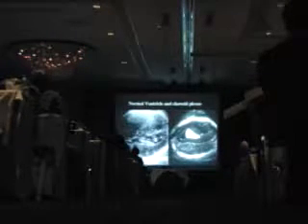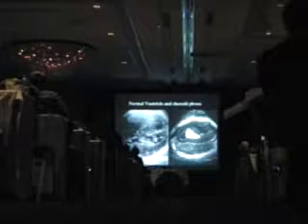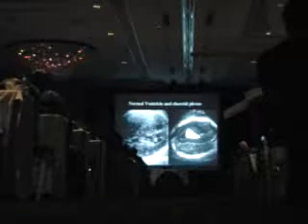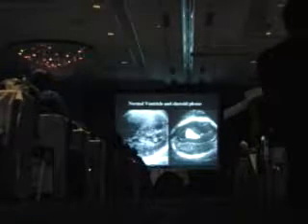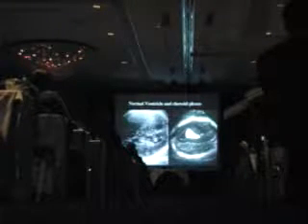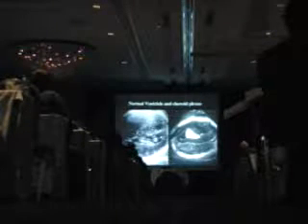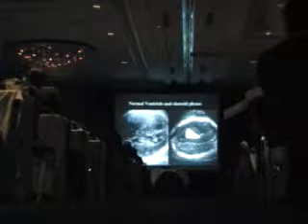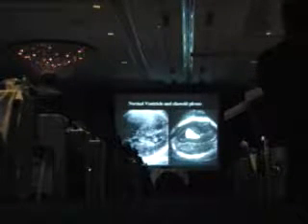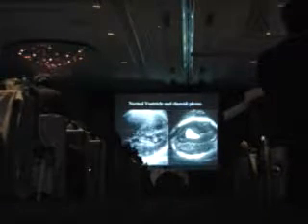And what's nice about this measurement is that it is one of the few measurements, in fact, it may even be the only measurement that is constant throughout the second and third trimester. There is hardly any other measurement in the fetus that is the same throughout gestation in the second and third trimester. So you can measure it. It should be less than 10 millimeters. Typically, it's about 6 or 7 millimeters.